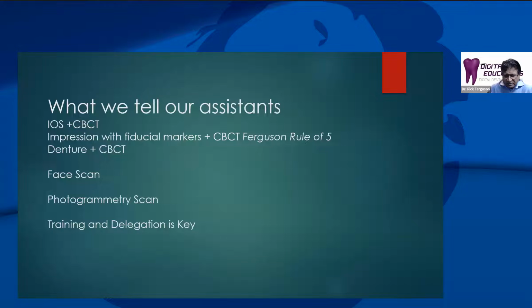The interesting thing is that a lot of folks ask me, is there an alternative to photogrammetry? And photogrammetry is sort of the gold standard right now. You have companies like Nexus IOS, which is another alternative. We don't really have a lot of data on that right now. So what I'm telling folks as of today is, if you're not using photogrammetry, then you should be verifying your implant positions for your all-on-X type cases using a verification jig and using some sort of analog technique.